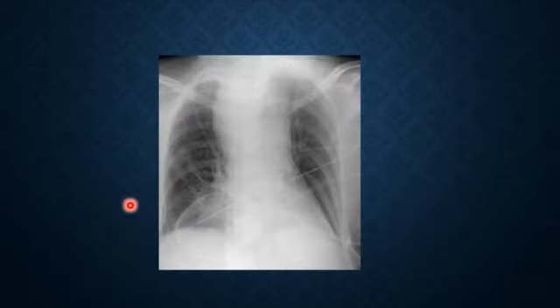Look here. This big mediastinal mass extends above the clavicle. The upper border here, above the clavicle, is it well defined or poorly defined? Not the superior part, this part, the part above the clavicle. It is well defined, so it is surrounded by lung. So it is a middle or posterior mass.